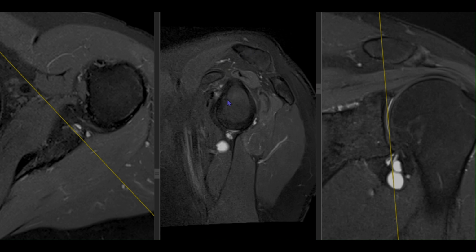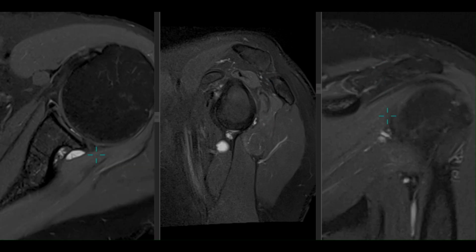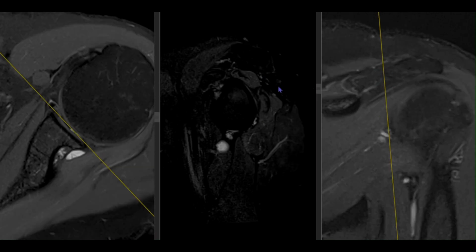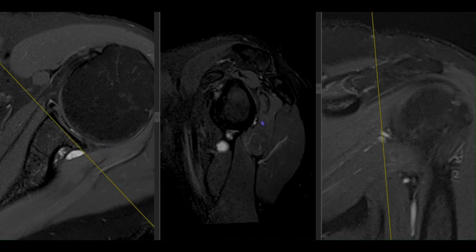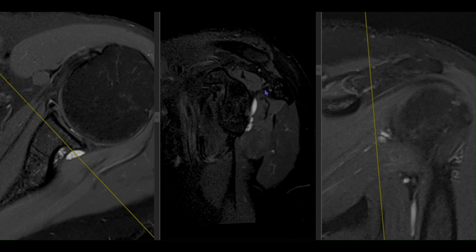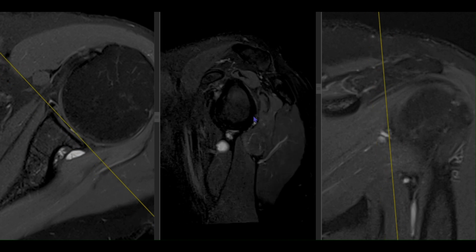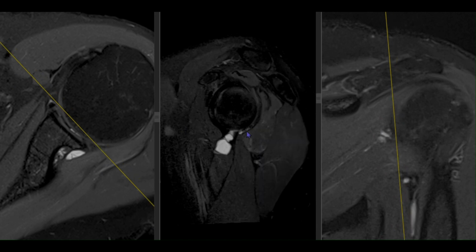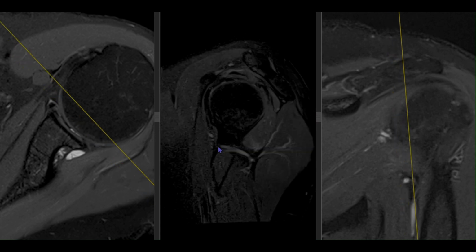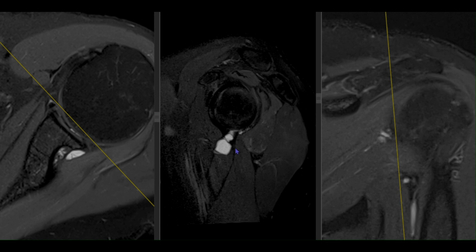If we are seeing denervation changes, we need to see what kind of distribution there is. The pattern is involvement of the supra- and infraspinatus, which get supplied via the suprascapular nerve which passes through the spinoglenoid notch. So this paralabral cyst would be causing compression over here. The teres minor denervation that we see is supplied via the axillary nerve, so this paralabral cyst which is extending into the quadrangular space may be the causative factor for that.